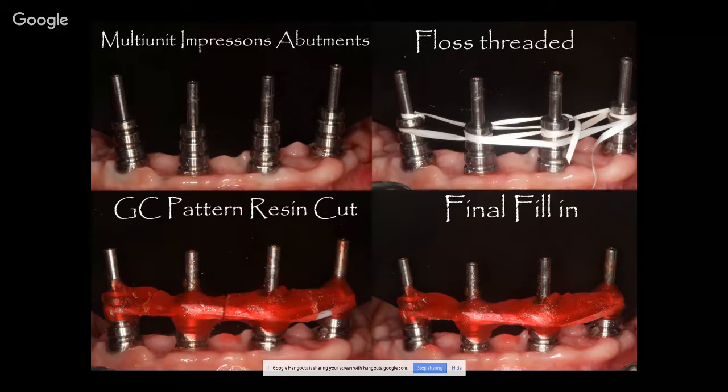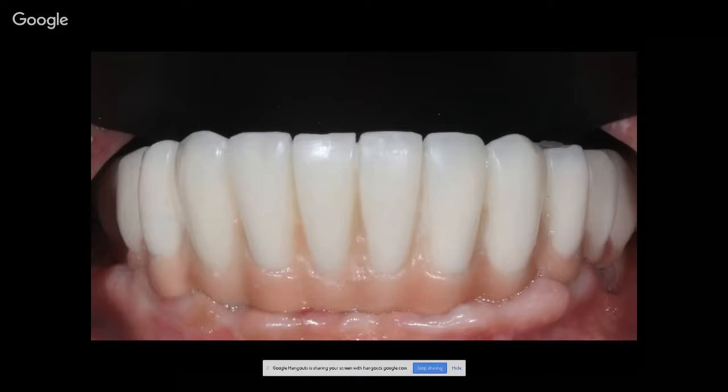Again, the same process to design everything in 3D and get a beautiful final restorative outcome that looks something like this, that is screw retained. I'm very big on screwmentation.